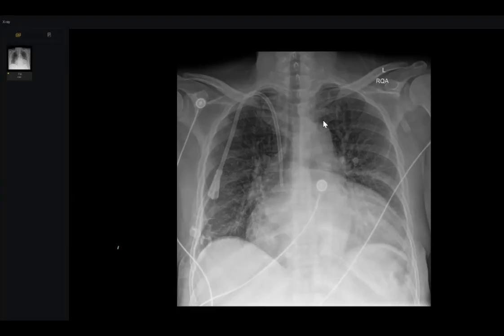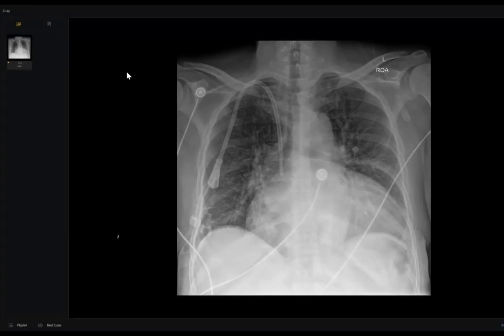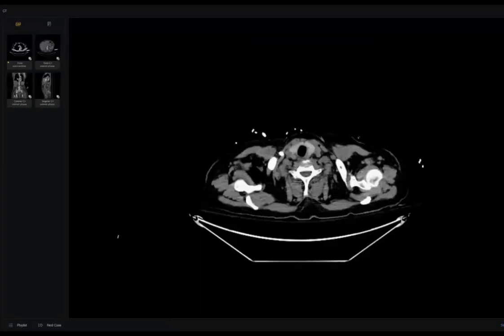I can also see that the bilateral hila are bulky. Predominantly, the right one is more bulky. There is also mild upper lobe diversion seen, so it is most likely representing a patient with congestive cardiac failure with developing pulmonary edema and pulmonary hypertension. Further, I would like to know the previous record of the patient if available and previous X-ray for comparison. And I will tell the findings to the referring physician. And if the patient is in the department, I will do CT chest for further evaluation.